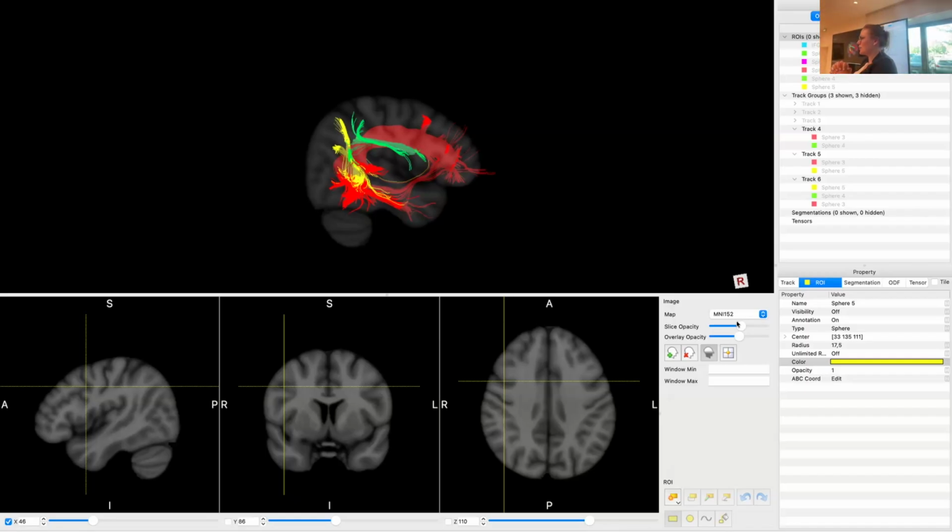Okay, we have about 15 more minutes. One of the questions that came up is how do you do the uncinate fasciculus? So the language network is often separated into dorsal and ventral, which we can have a long discussion about tomorrow if that actually makes sense. But part of the ventral connection is the uncinate fasciculus. What does uncinate mean?